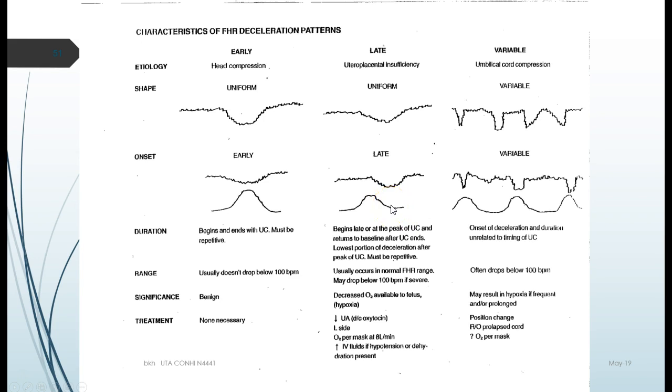And typically, if we had a healthy placenta, this insult would not hurt this kiddo, just like this one. These could be the same strength of contraction. But when we have good blood flow, our baby holds his breath during that contraction, no problem. This baby didn't have any reserve to begin with. And so this contraction insults him every time because he can't go that 30-40 seconds without his oxygen.